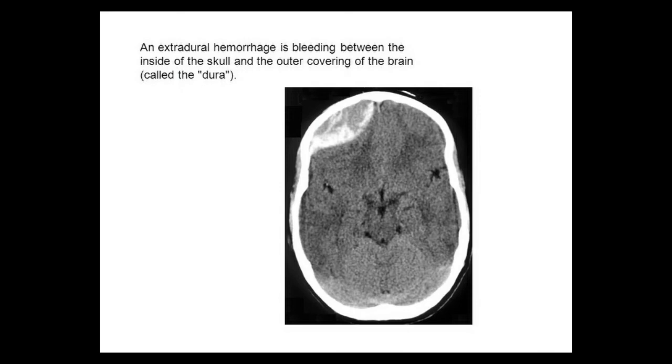This is the case of an extradural hemorrhage where there is bleeding between the inside of the skull and the outer covering of the brain, that is called dura.